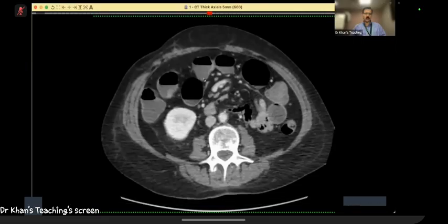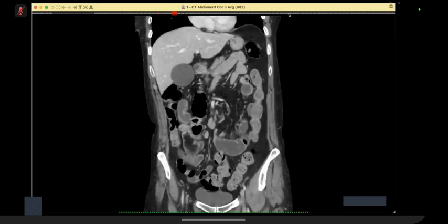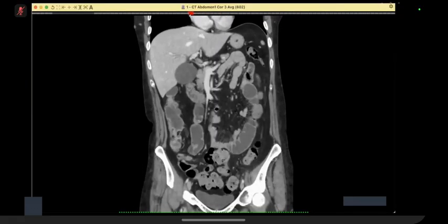Just one second. Don't move. Over to you. Yes, here in the coronal, I can see that there is a small bubble. Yes, doctor. In this sequence, I can see there is a cluster of small bowel loops centered at the mid. Please move your mouse. Don't be static right now. Okay. You will move your mouse, request again, I think. Yeah, it's moving. Yeah, it's working.